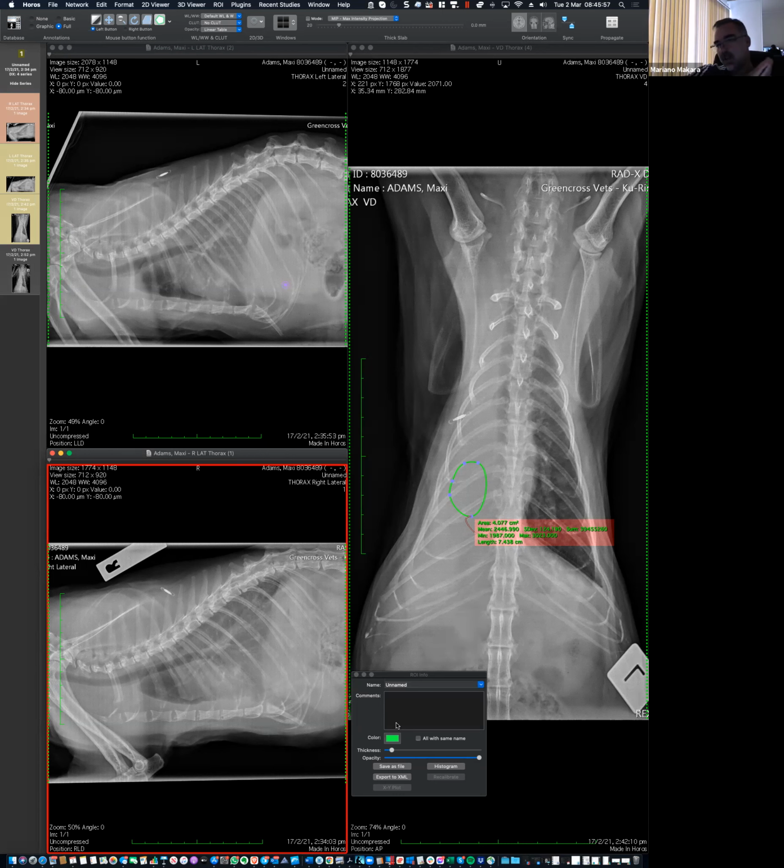If you just erase all that lung, and the amount of gas in that lung is not going to change depending on positioning, then the expectation of having this, or let me rewind and go even back.